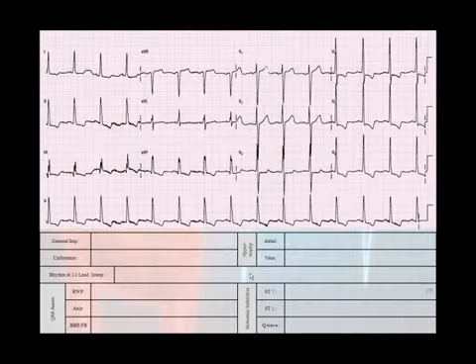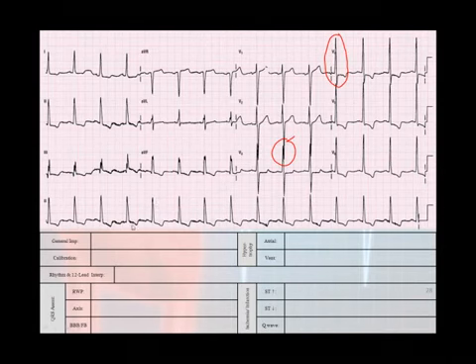When you glance at that 12 lead, you want to say, is it excessively fast, excessively slow, or any ugly morphologies? The only real ugliness you can see here is your ST segments look a little off, which doesn't actually look all that good. You can also see here that these QRSs are actually touching. These QRSs look really tall. Does it look ugly? Not necessarily, but you do see some anomalies there. So for general impression, what you can say is tall QRSs, or you could just say looks fine, doesn't look ugly, but it does not look fast or slow.